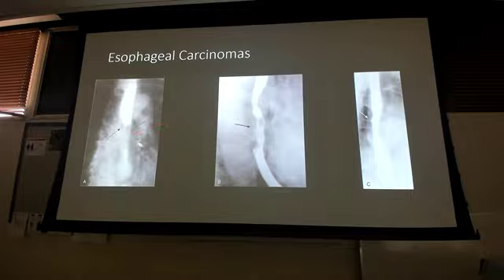Okay? Can I call this a filling defect, right? We last talked about the peristalsing, right? How do I know that's a defect or some mass or something and not the peristalsis thing? I don't have the smooth edge on each side like before. If you notice on the normal, go back and look at that one if you have it available.